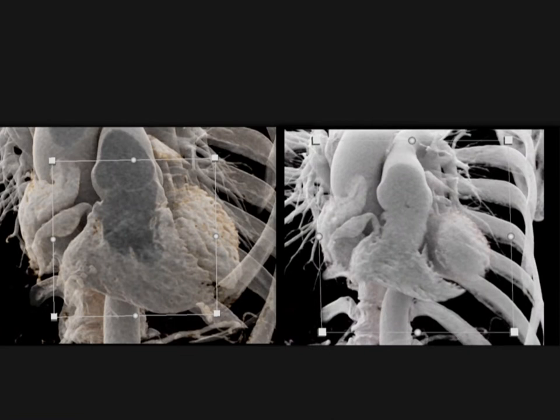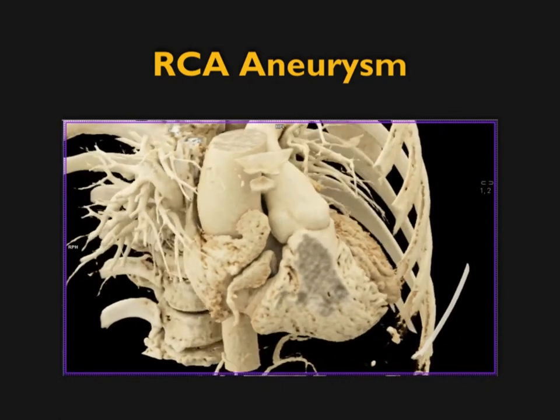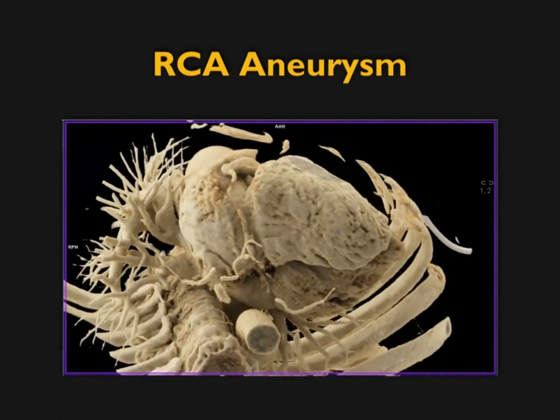And then I'll change the parameters again, nicely showing you the aortic valve, showing you the patient's right coronary artery aneurysm through a range of views and perspectives. And of course, you can do this with motion to really get a good feel. And here I'm simply rotating the data set. This is a relatively high opacification. I'm showing you the patient's right coronary artery, very nicely seen.